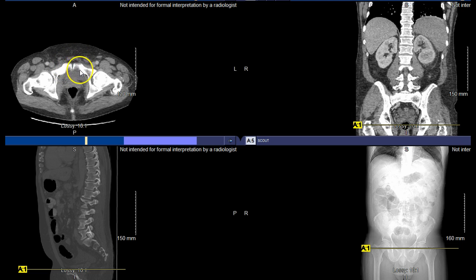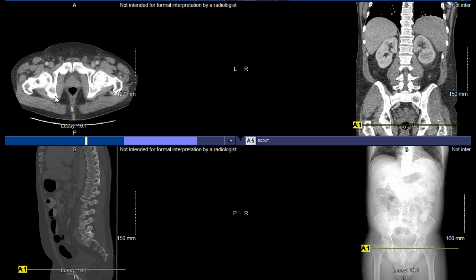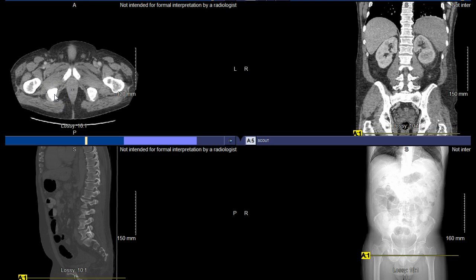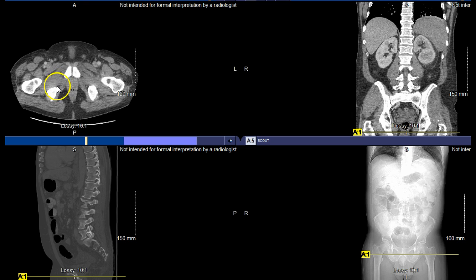So of course that would make these pelvic bones, and then on the back side of things, you can see what would classically be referred to as the ischial tuberosities here on the back end. And what's cool is we're seeing this separation of bones here. Based on the slice that's taken, they appear to be separated, but in reality, these bones are connected.